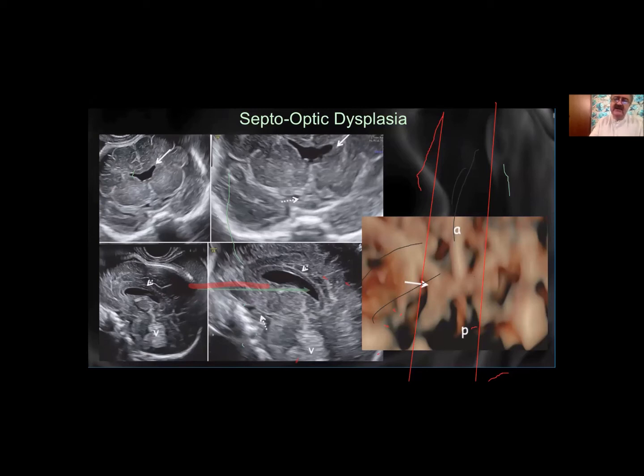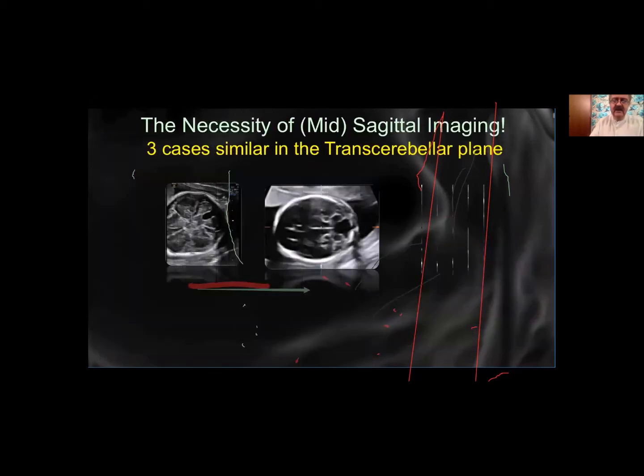So again, like I said, the basis is a good medium-end ultrasound scan supplemented by a high-end ultrasound scan and genetic inputs. In the brain again, once upon a time, if I saw any of these, I would tend towards giving a poor prognosis. Hole in the back of the brain.